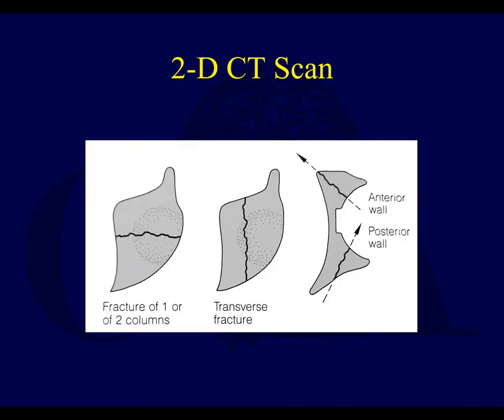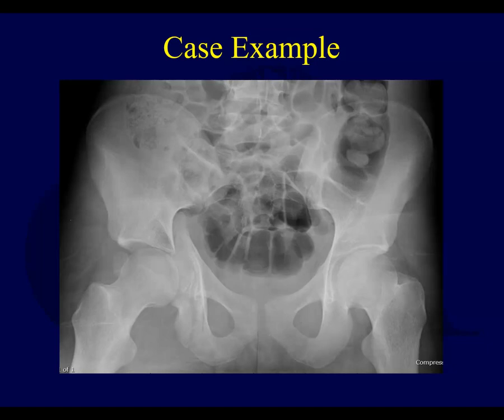Here are some examples of what you may look for on an axial CT scan that correspond to fractures. Making diagnoses of fracture types or classification from axial CT scans is very difficult, and to some degree you need to use it in combination with plain radiographs or 3D recons to really understand a fracture pattern. But here's an example. Here you can see there's clearly a fracture line.